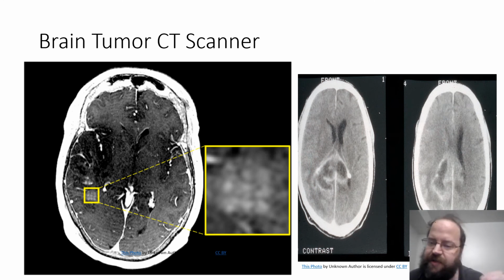It stands out differently because it absorbs more x-rays, and therefore what comes out of the machine is less. You can see on the CT scanner, and they also have some tissue shrinkage generally, but those areas that are targeted in the yellow box stand out, and that tissue there is small calcifications, as well as they've already placed their small radioactive source to begin treatment.